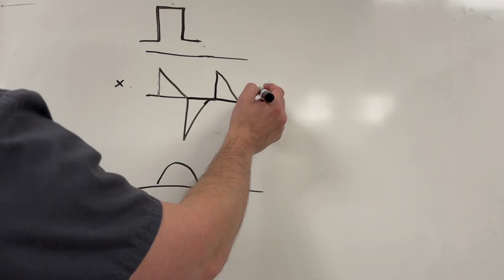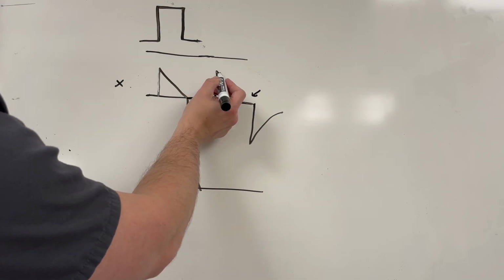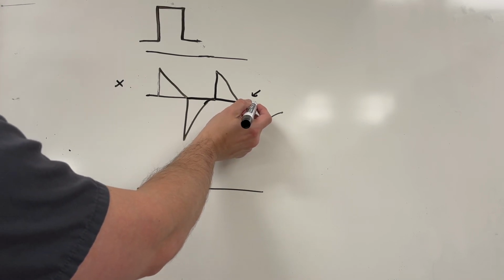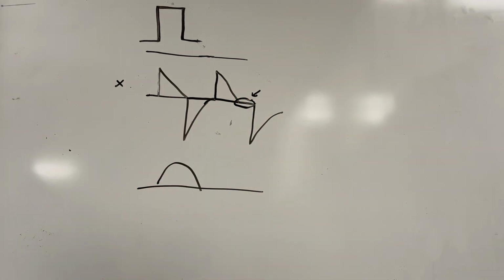So this little part right here, imagine yourself taking a breath, breathing in, breathing in, breathing in. You get to where you can't take a breath anymore, and now we're just doing a breath hold. So this riding of zero flow right here during the inspiratory phase is a breath hold.